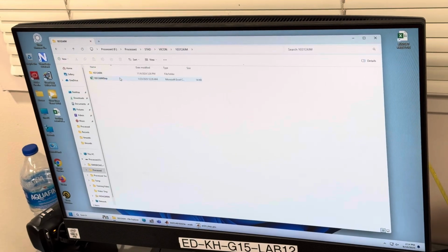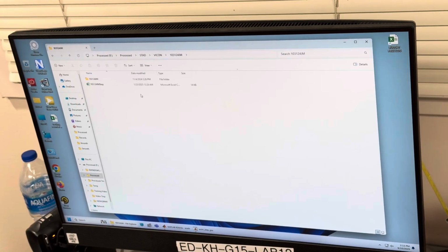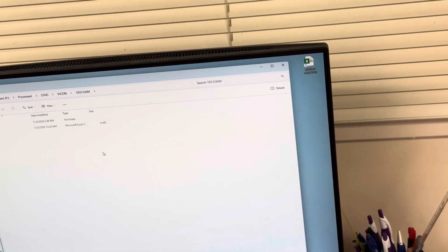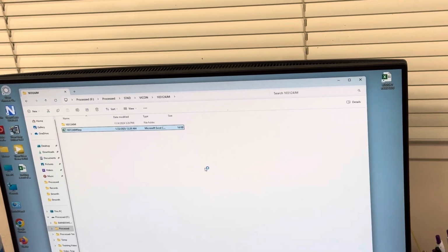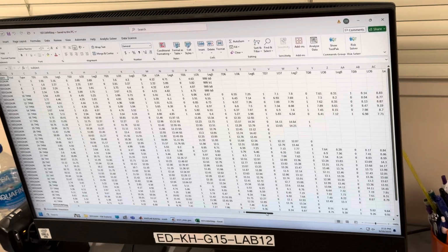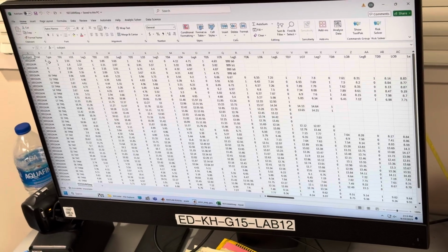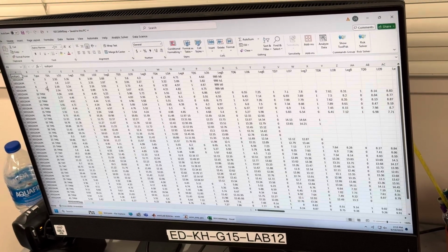And it's very important that it's a CSV file. So you can work on it in Excel, but just make sure when you save it, it's not a spreadsheet, it's a CSV file. Because we'll need it to be a CSV for later analysis. And it'll make more sense. So let me just open this as an example to show you what it looks like. Good. So this is a completed steptime file for this subject. As you can see, these were overground walking trials.